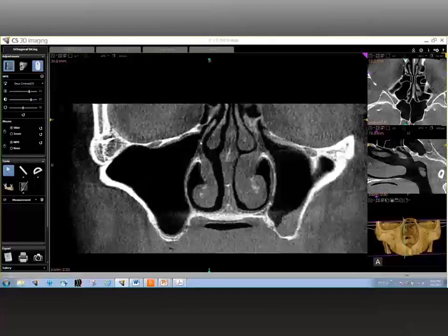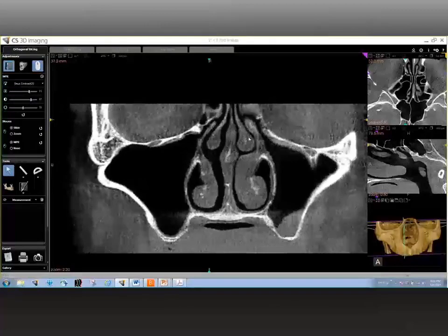The ostium can be bilaterally visualized right in that area, and you can see it extending all the way from the sinus into the nasal cavity. Now, keep in mind, the nasal cavity also can be visualized in the maxillary sinus, so it might be of importance to keep an eye on any kind of disease that could happen within the nasal cavity.